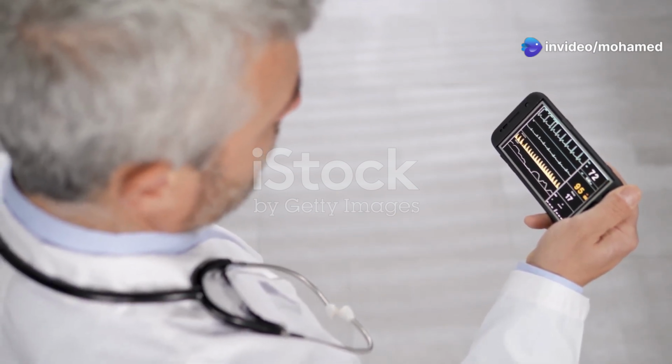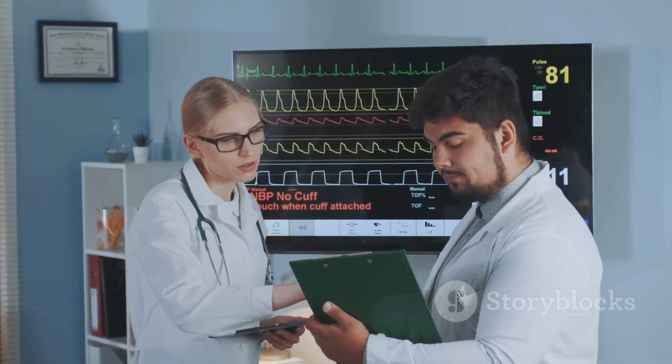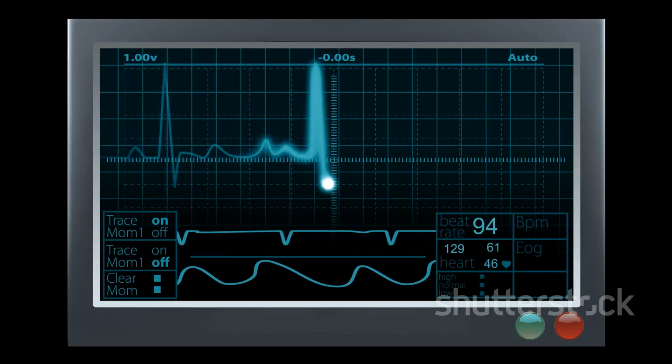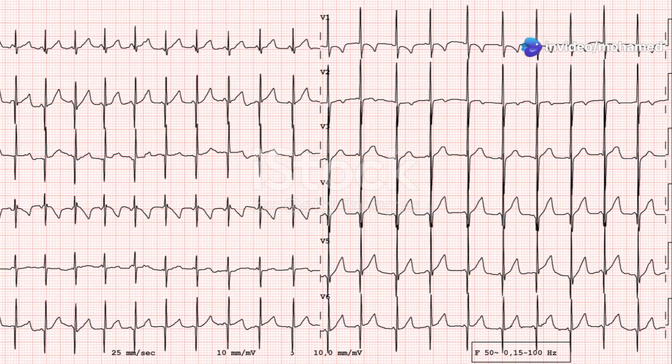Section 8: Recognizing a normal ECG. Now that we've covered the basic components, let's summarize the key features of a normal ECG. Heart rate: 60 to 100 beats per minute. Rhythm: regular, with each heartbeat occurring at regular intervals. P wave: present, upright, and preceding each QRS complex.